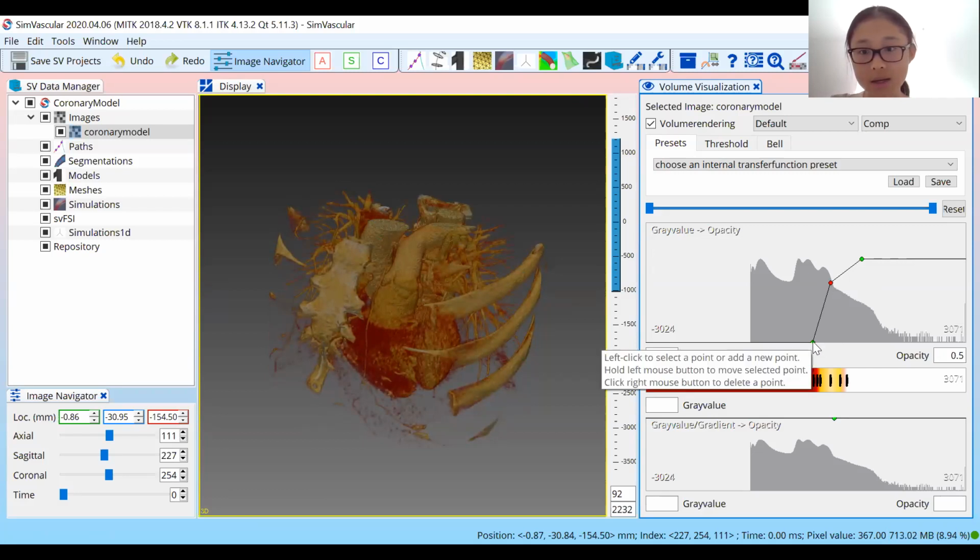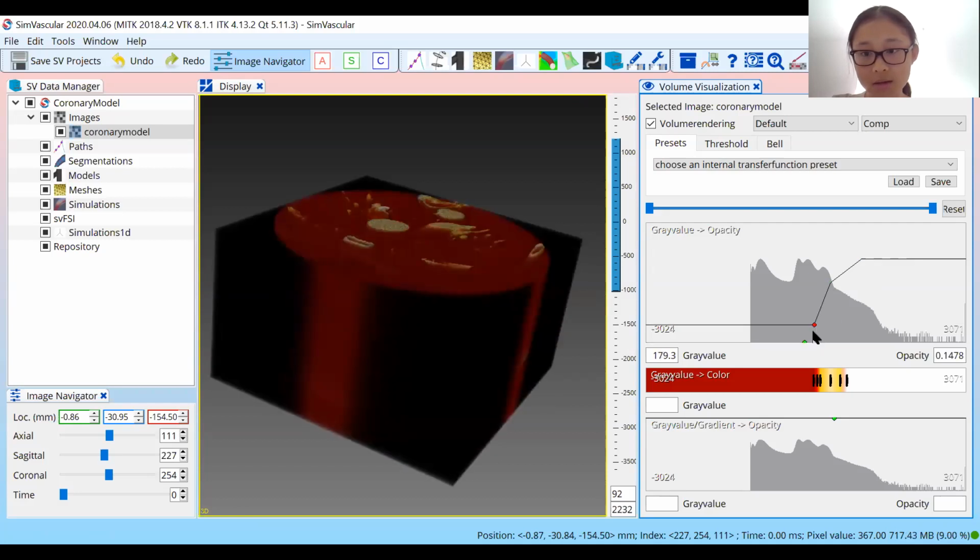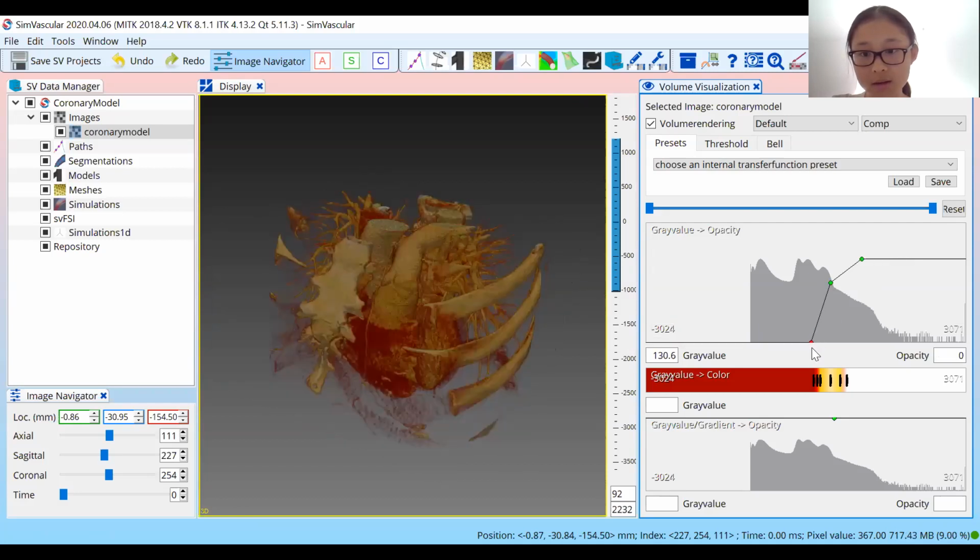And then I'll drag this bottom point to about 120 or so that we said. You can also enter a value directly, but I think 130 is okay as well. So this bottom point here just indicates that any pixel values below that will not show up. The highest point will show up with the most color. And I think that we just place that somewhere at the center of our pixel range.